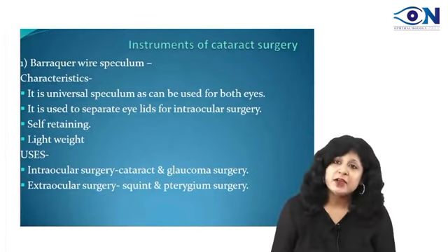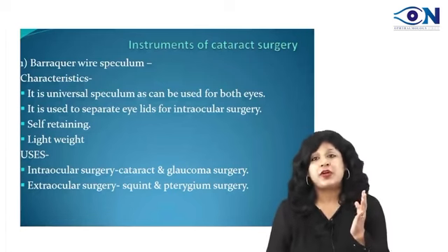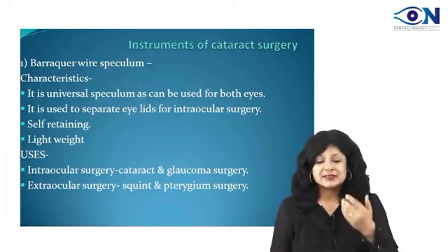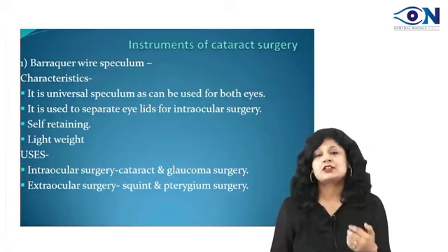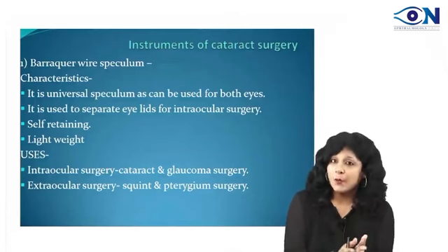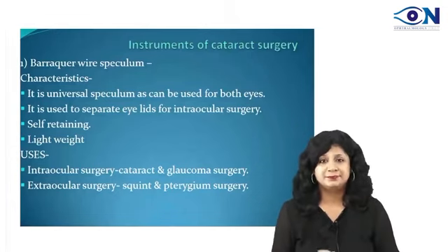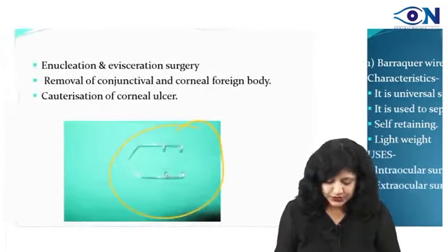So whenever you are doing any intraocular surgery, extraocular surgeries, you require this speculum. So that is the purpose I started with this, because the moment you are into the procedures, whether it's in the OPD or whether it's in the OT, you have to know this. Alright. So this was your first one.